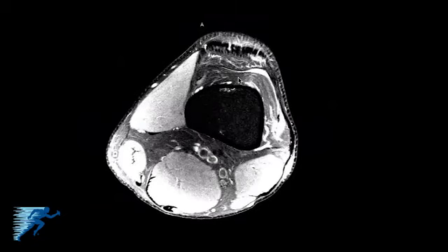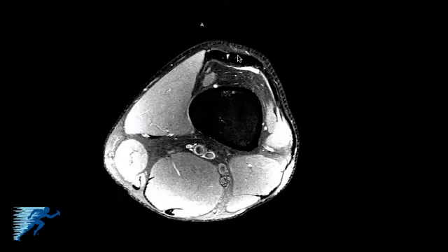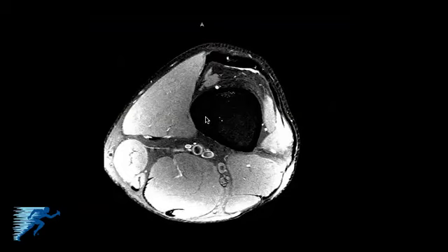Finally, the things that we look for more proximal to the patella would be the quadriceps tendon, and we can see if there's any degeneration or if it looks like a normal tendon like we see here, with the normal dark outline, and we can see the outline of the vastus medialis muscle as we get more proximal along the joint.